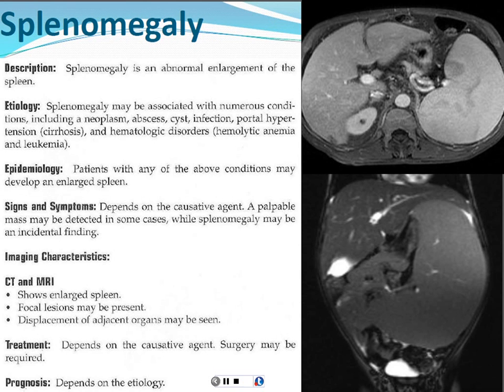And so, if you start to see changes of an enlarging spleen along with those early changes of cirrhosis, then you need to alert the clinicians with imaging that the blood flow patterns are starting to be altered here. Once you see that, you'll start to look for the collateral vessels around here. They'll get varices around their distal esophagus, which they're at risk for bleeding from, or around their stomach. And they're also at increased risk of rupturing the spleen, especially if they have any trauma.